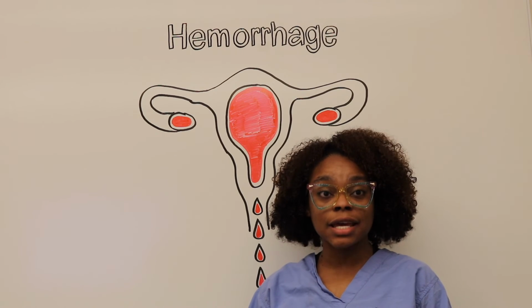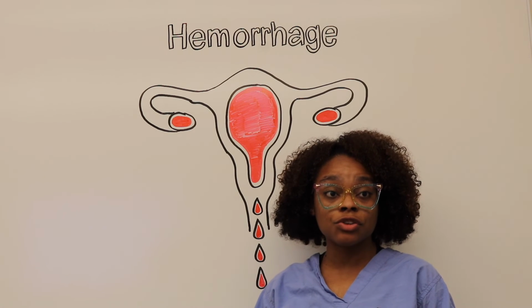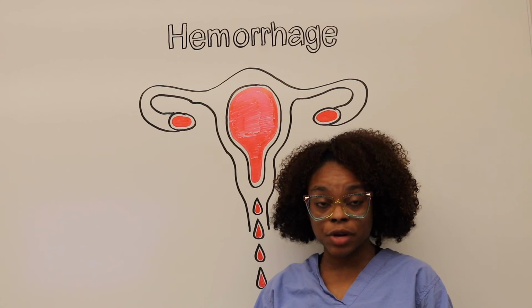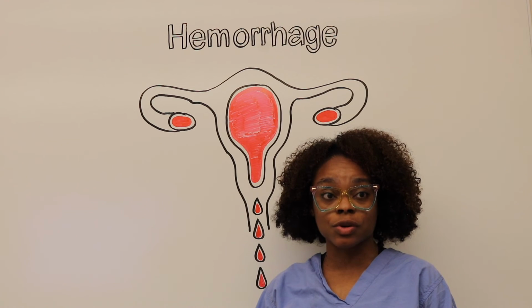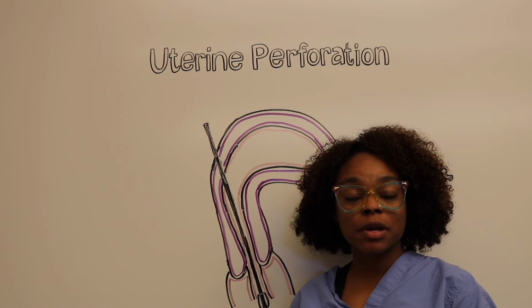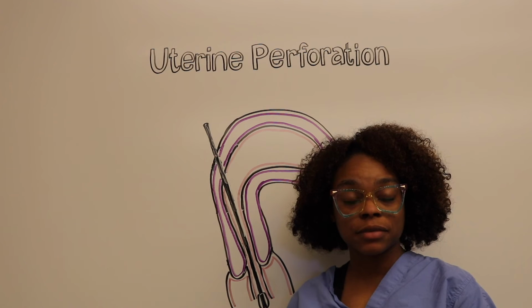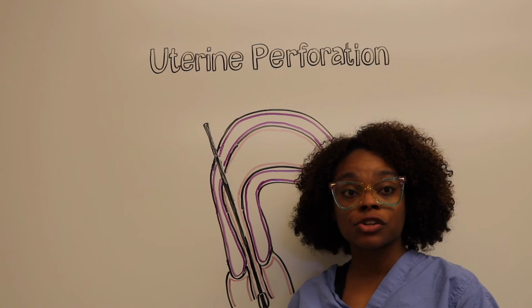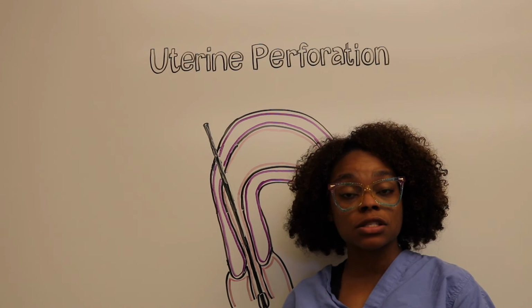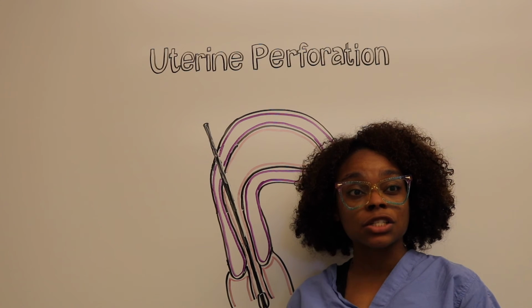Laparoscopy with suturing can be used to stop bleeding secondary to uterine perforation. Uterine artery embolization and hysterectomy are used as last resorts for uncontrolled bleeding. The most common perioperative complication during hysteroscopy is uterine perforation. Uterine perforation can occur during cervical dilation, insertion of the hysteroscope, or with use of operative devices such as resectoscopes or morcellators.